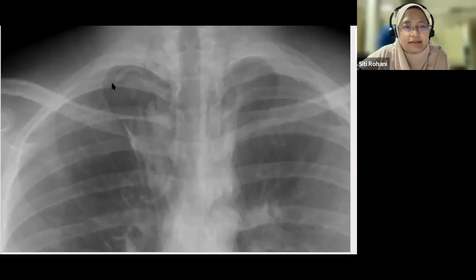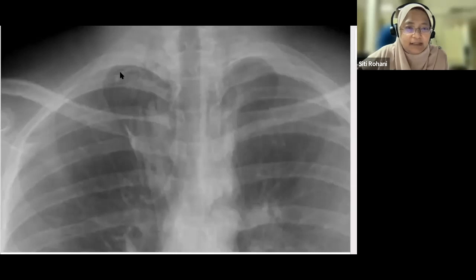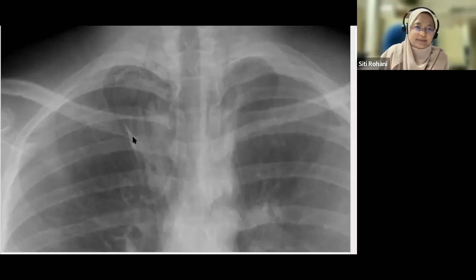This patient has an azygous fissure. This is a normal variant. I think that's what makes the round-shaped pneumothorax. So not everybody has that azygous lobe or azygous fissure. Yeah, true. Not everybody has this azygous lobe or azygous fissure.